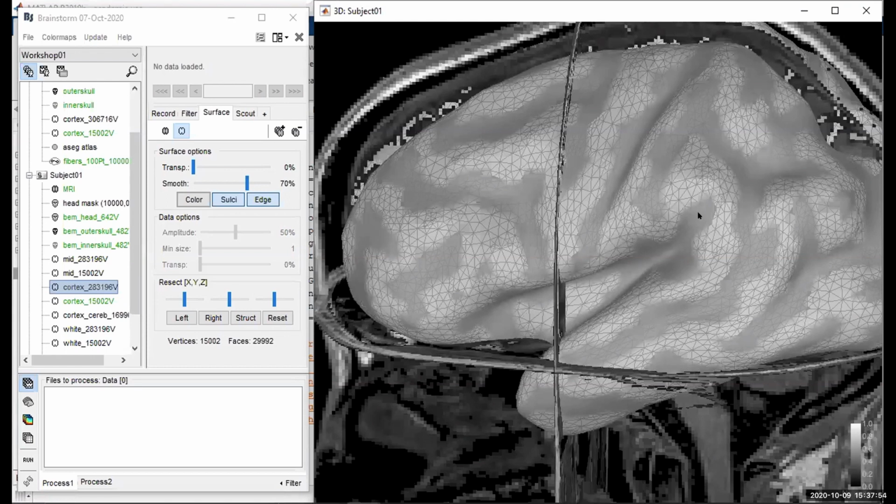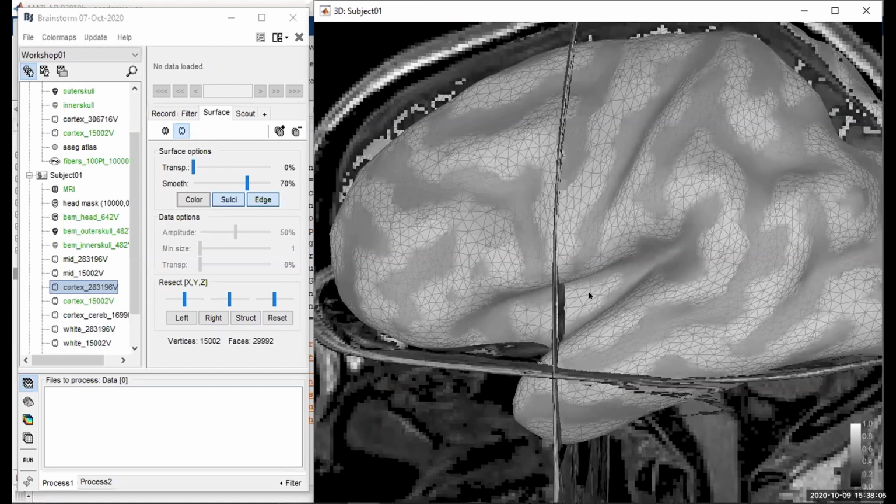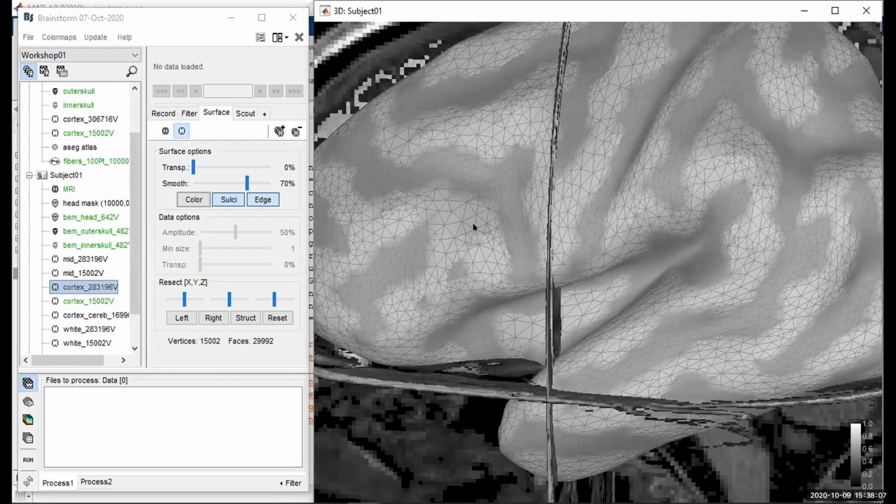Also, when we project our data from the sensor space to the source space, and hopefully we will make that clearer later in the demo, just note that all of the different edges that we're showing here, and by edges I mean all the points that intersect different triangles, this is what we will use to decide where to fit dipoles when we want to do source reconstruction.